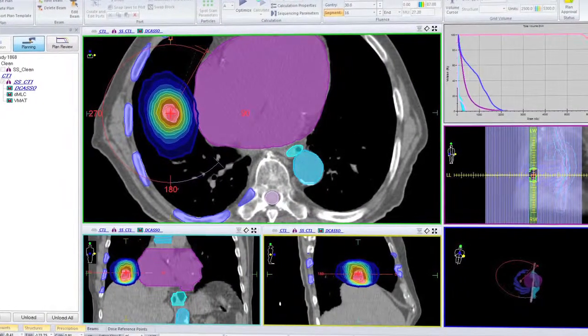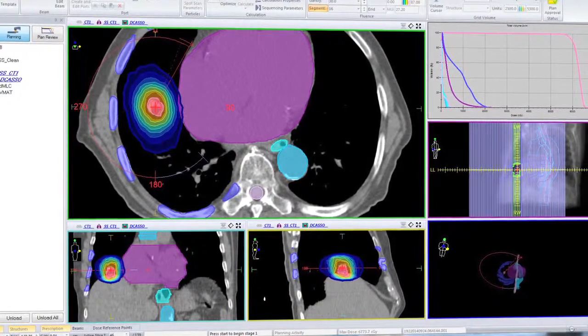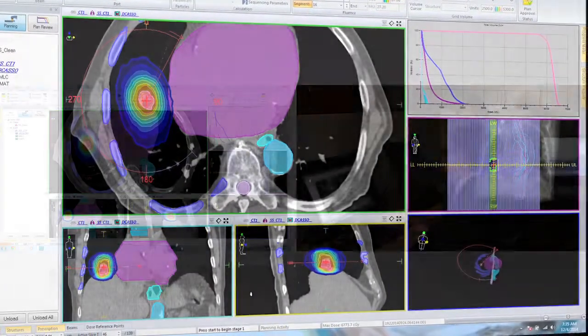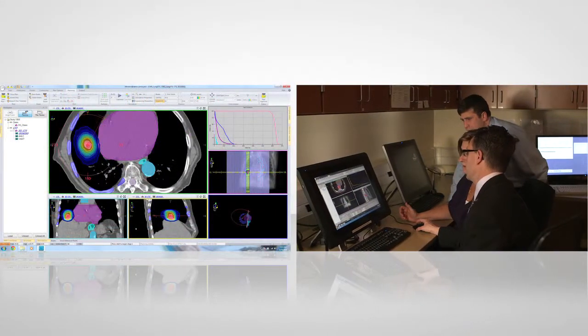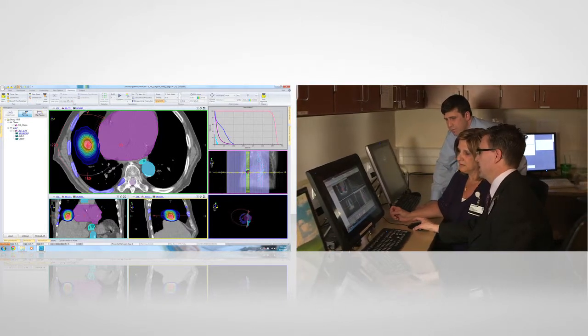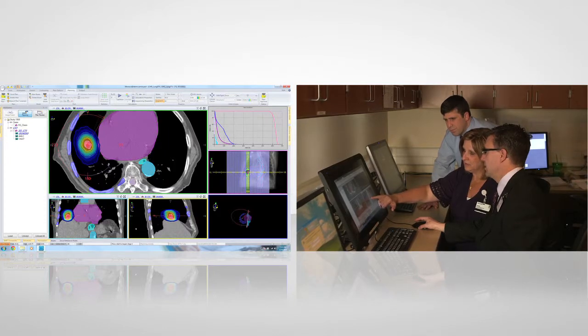Using sophisticated software, radiation treatment planning specialists can now calculate the exact details of your prescribed radiation treatment delivery. These planning specialists, a medical physicist and a radiation dosimetrist, work together to plan the intensity, shape, and path of the radiation beams.